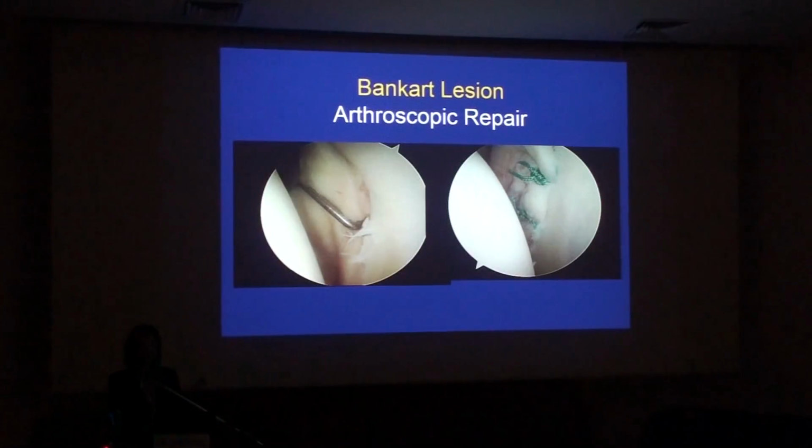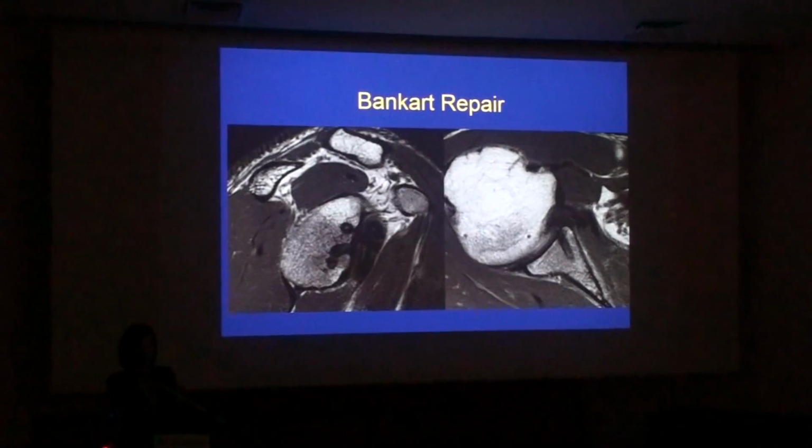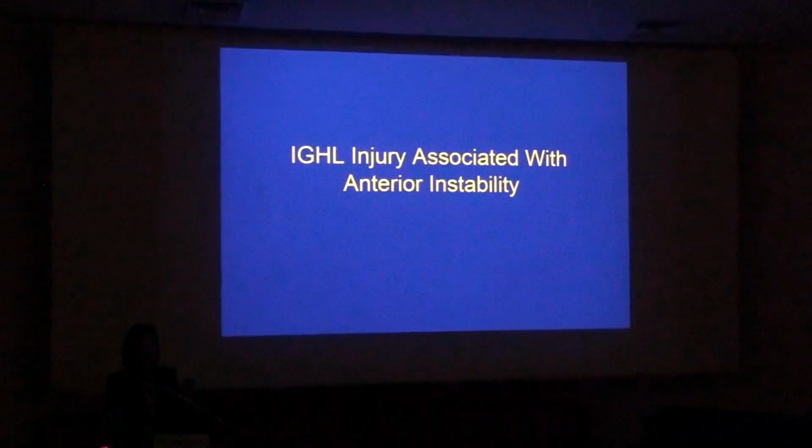They do it arthroscopically, and on MR you're going to see the little tracts in the anterior glenoid, even if they just look like cysts on x-ray, and you see them very nicely. The labrum itself might be blunted, but it usually does not have contrast going inside. Otherwise, you've got a re-tear, or if it's displaced, you want to mention that.